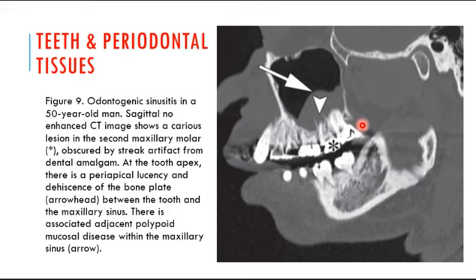As we know, the most common infection is dental caries. The dental caries will make a defect on the crown of the teeth, and it will involve it like a channel. Sometimes the crown will be absent because of the severe dental caries. It will reach the pulp and may involve the alveolar bony areas, and it may extend into the sinuses and cause a maxillary sinusitis.